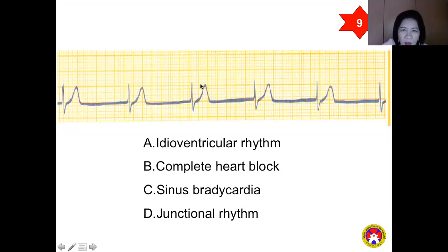Look at the rate, 300, 150, 100, 75, 60, 50. So this is less than 50. And your AV node will fire from 40 to 60 per minute, so this is within the firing of our AV node. Here you don't see retrograde depolarization of the atria because you don't see an inverted P just before or just after the QRS complex.